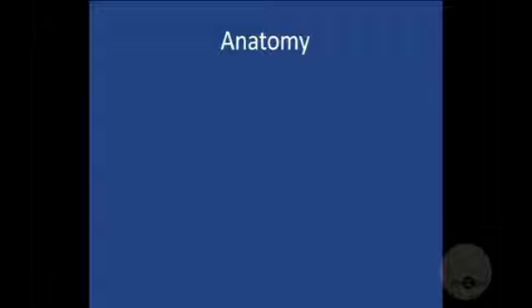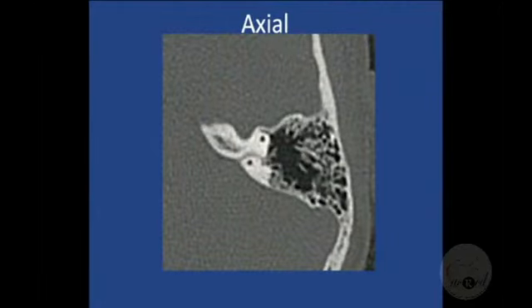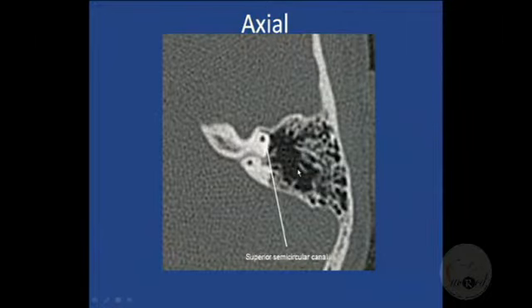Okay. And just to start off with normal anatomy, I just want you to comment on and pick up the findings. There's really nothing tough. So comment, what are these 2 structures? This is just to bring the talk to the rhythm. Superior semicircular canals. What is this one here? Sorry? Correct. Or subarcuate canal, or petromastoid canal, all the same.